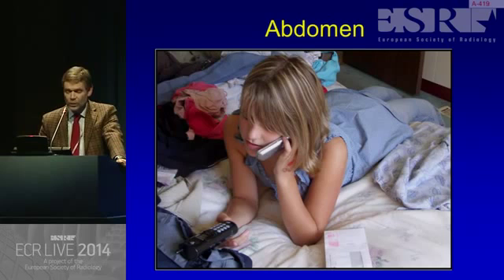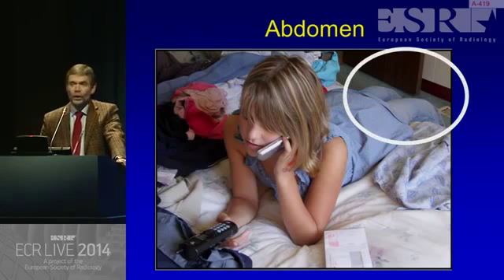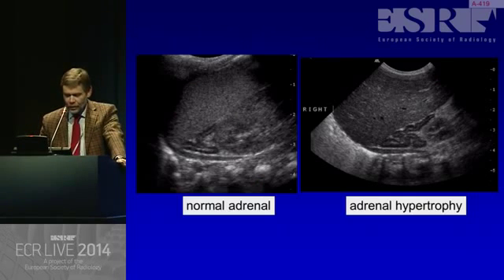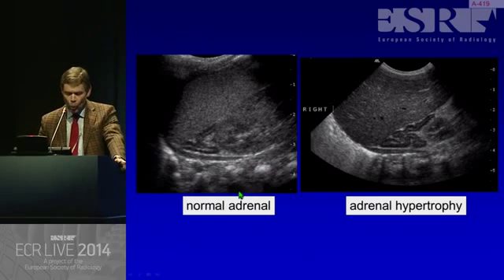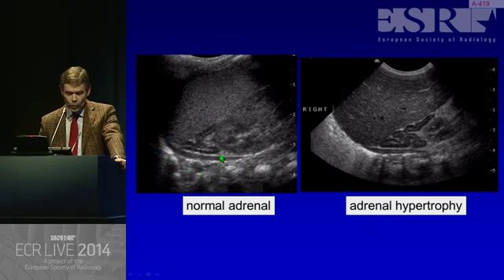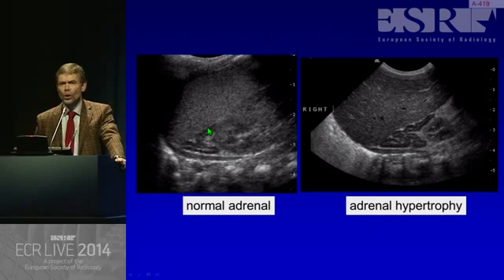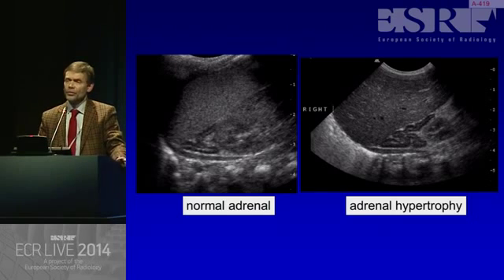So let's move down to the abdomen. And of course, you as a radiologist have seen the abnormality, talking about inversion. First of all, many, if not any, adult radiologists don't know what this is. Pediatric radiologists know. But when my residents see it for the first time, they have all kind of fantasies about the silly structure above the kidney, which is a completely normal adrenal gland. It's huge in infants. I don't know why it is so huge. It doesn't disappear, of course, but it shrinks within a few months until it's almost invisible on ultrasonography.